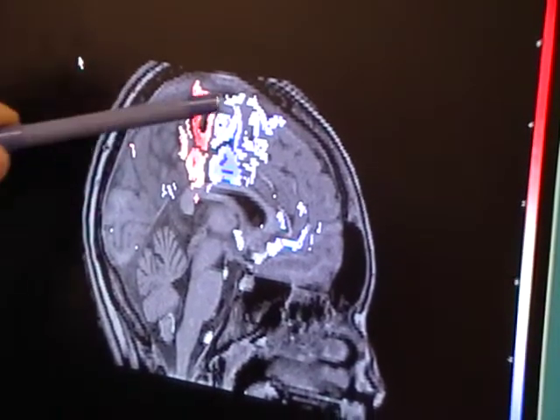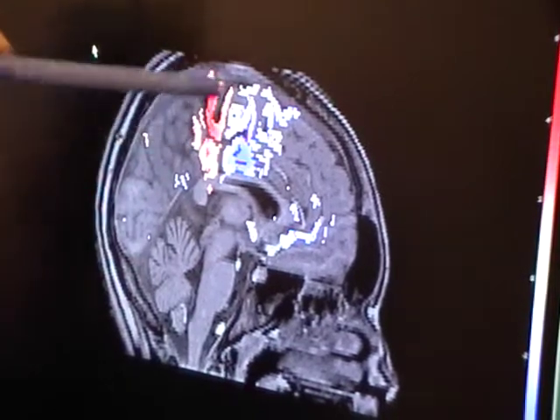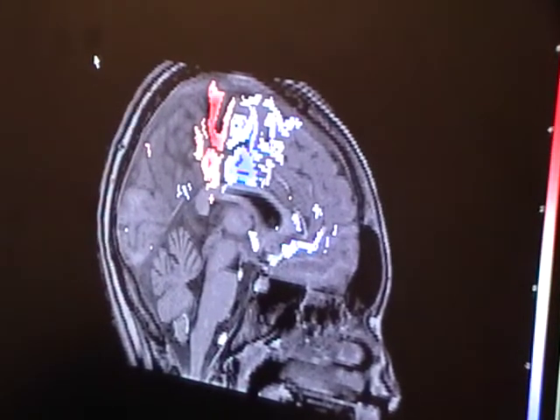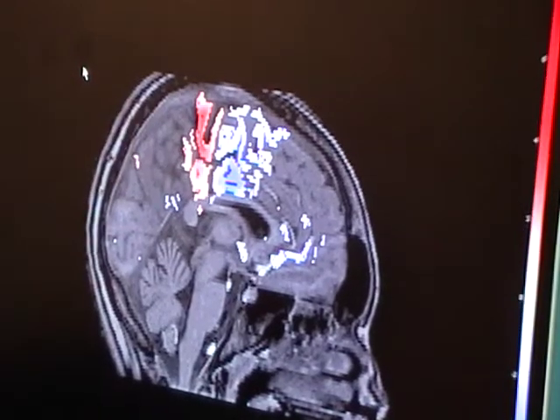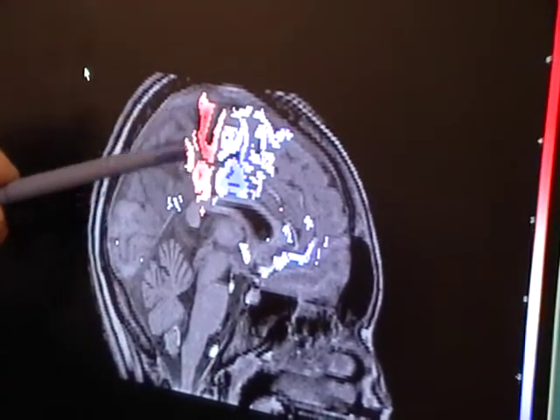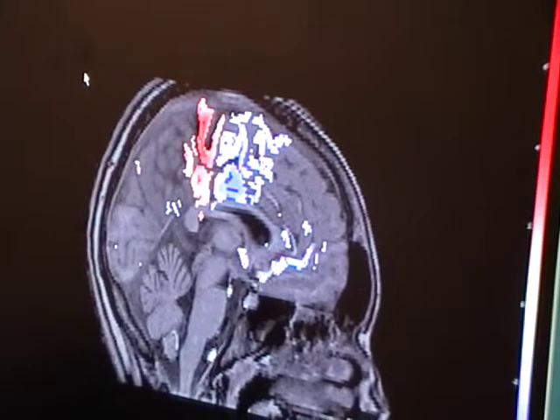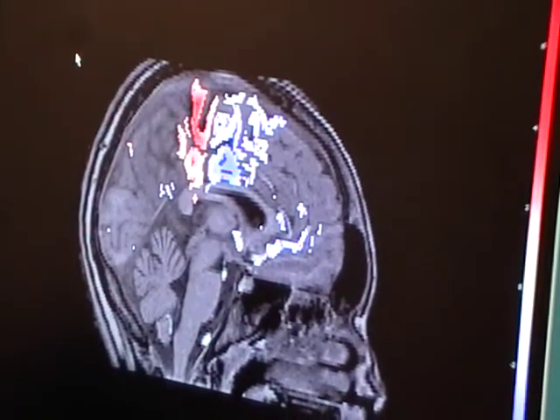So in the case of this patient, this brain area has been investigated by the surgeon, and a subset of this cluster of blue activity has been removed, and the surgical outcome has been very positive for that patient, because with MEG we were able to map out the healthy part of the brain that was functioning with respect to hand coordination and hand motor skills.